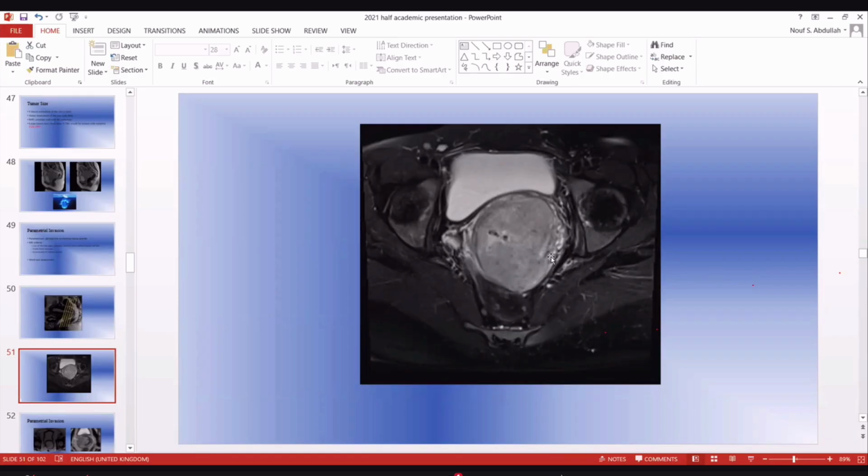So if you look, this case is very similar to the other case. You see cervical lesion, you have the cervical stroma ring, you have some interruption, so you might suspect that there is a parametrial invasion. However, I don't see frank tissue extension into the parametrium. So this case, it could be easily stage 2B cervical cancer.